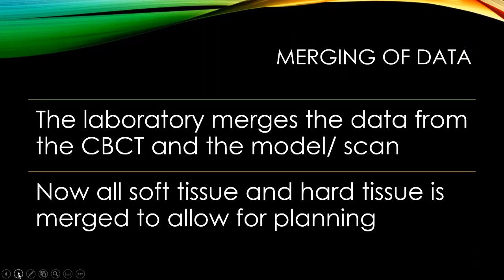So once we have the data in the laboratory, what happens is we merge the data. And this is one of the more interesting things here, and this is one of the biggest innovations. Again, as I mentioned before, in the past, to fabricate a guide, it required several additional steps. You had to create a stent or a denture, and that would have to be scanned in the patient's mouth. What that would do then is orient the guide markers to the bony structure. With the softwares today, we're able to merge the data from the CT and that stone model or scan. We're able to merge that together without having to make any additional appliances.